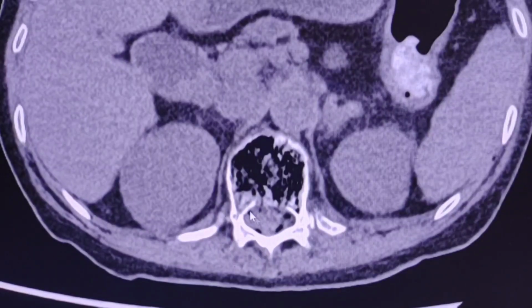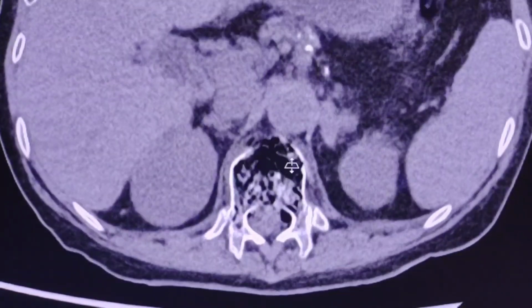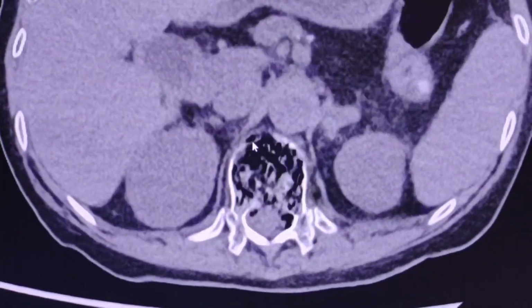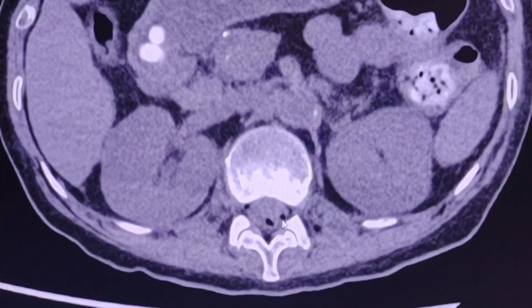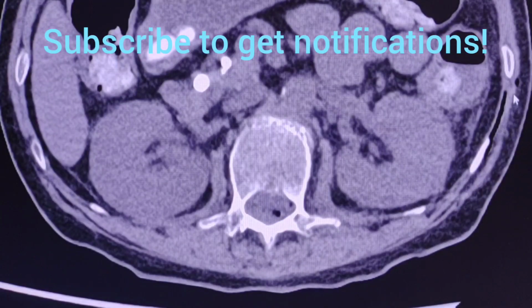Now let's discuss the finding. We can see that there is significant deformity and gas bubbles in the T12 vertebral body. Some gas bubbles extend into the paravertebral soft tissues, and most importantly, there is significant gas in the spinal canal.